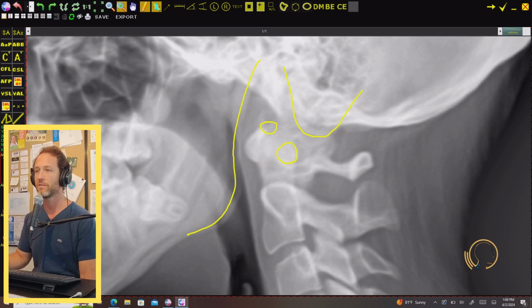But just by way of example, okay? If I assume that my transverse process is here, but it's actually here, now we got a problem. Why do we have a problem? Well, let's say I'm lining up my instrument. Let's say you got a posterior atlas that needs to be moving anterior. It's posterior. You're posterior to it, right?